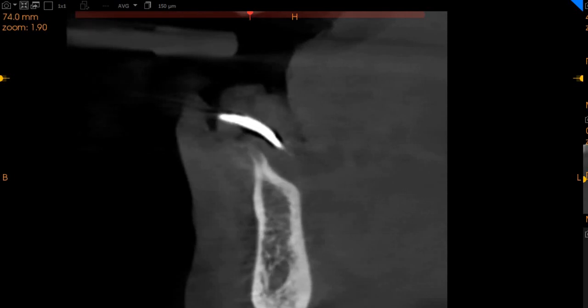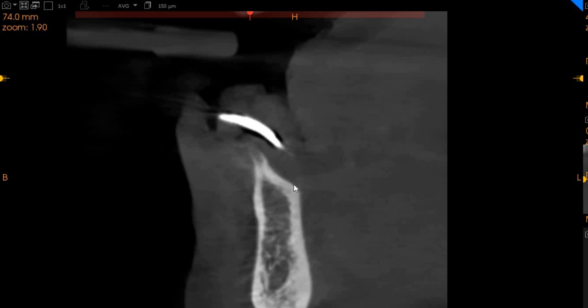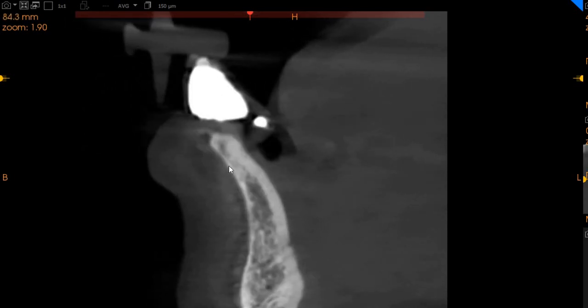We've got another just anterior to the canine. That was the first premolar region. Sorry, this is the canine region. If we remove the sharp bony ridge, we've got 5.4 millimeters of width with a good 10 millimeters of height. So first premolar and the canine, we've got some excellent bone. In the anterior segment, we have very limited bone. Either denser burrs will need to be used because we only have 3 millimeters of width, but we do have a significant 10 millimeters of height in this region.